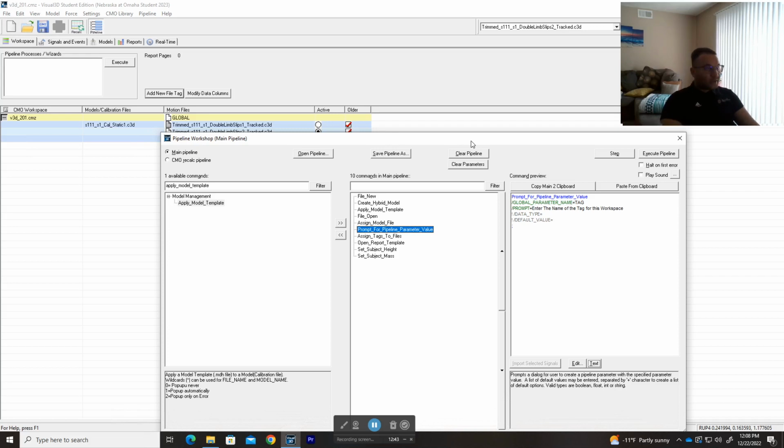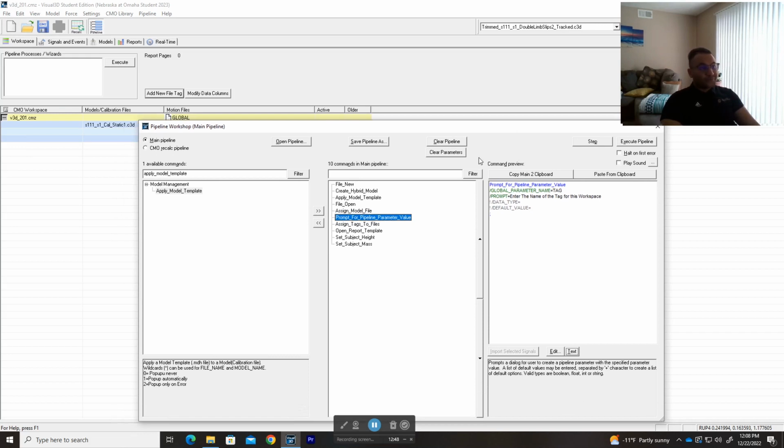So I also created that as well. I'll show you later all the tags that you create, but it's a very useful tool, and I'll show you how we can use it later on when we run specific pipeline commands.